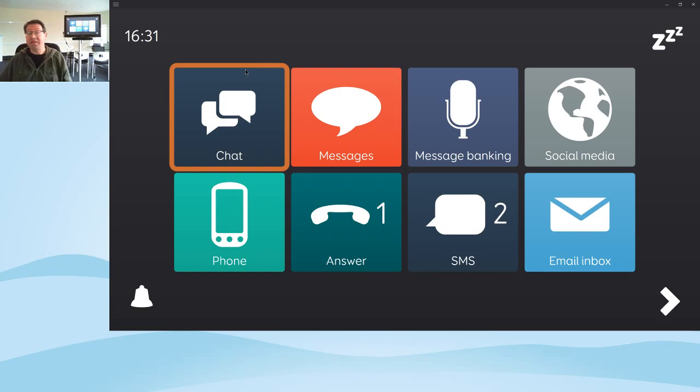So that is just a very quick overview, I guess, of what is available within FastTalker. I hope it's given you a good overview of what's in there, the difference between the two versions, and how to do some quick edits and personalization.